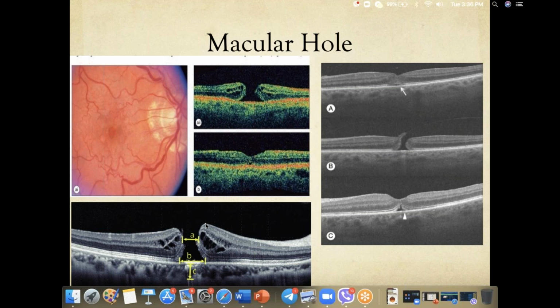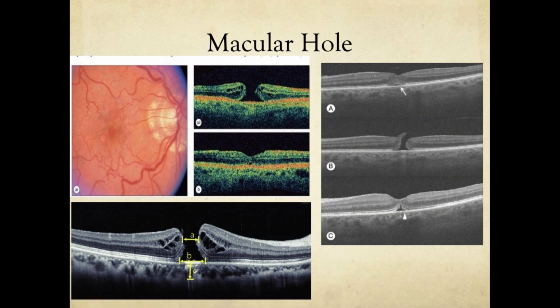And once the ILM is inverted, we can have the macular hole closed. So overall it has a very good prognosis anatomically, but vision wise I cannot guarantee the patient central vision as I do not see the rods and the cones in the central area. Fine. So that's how you plan for treatment in the macular hole.